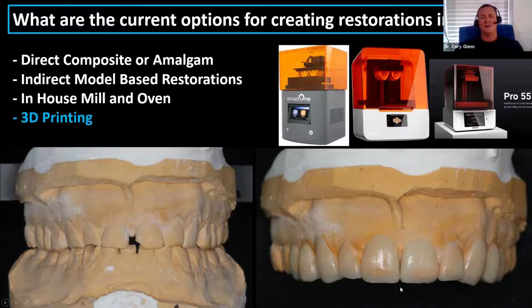What you're seeing down there is actually some no prep veneers that I had designed in Blue Sky Plan and then exported and printed. So this was purely a wear case. And so this guy, if I had a preoperative intraoral scan on him, we could design these, create the final restorations before he even comes back for a second appointment. And in one appointment could essentially do a full mouth rehab on him.